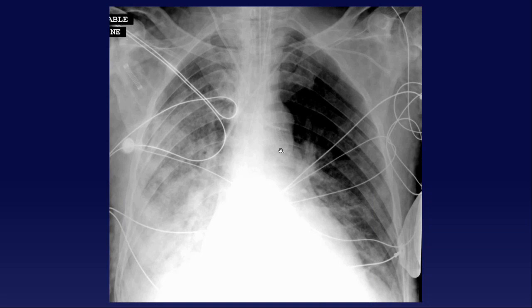Every once in a while, you can have patients with a bit of a lower innominate vein, but as far as I'm concerned, I would say don't use this one. This could be an arterial line, unless you've got a CT showing that they've just got a low left innominate vein, and this is actually still not well positioned. So this is concerning for an arterial line. And there's one important thing to note about an arterial line. What would you guys do if you found an arterial line, other than not use it? Any thoughts?